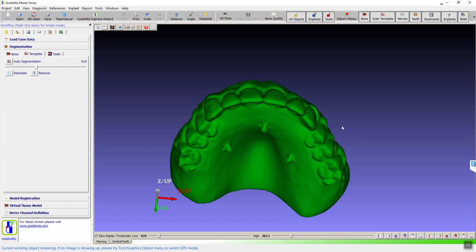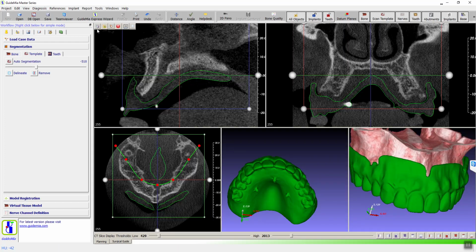We'll see how it goes. Let's continue the treatment plan. So I think for this first case that we do, could we potentially print a couple of different guides? Like, can we do one using the SureMarkers so I can see how it fits, and then we can do one without the SureMarkers? Well, I wouldn't care actually. We should be able to take care of it anyways.